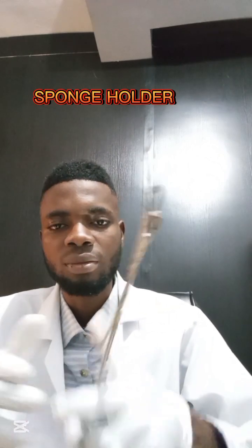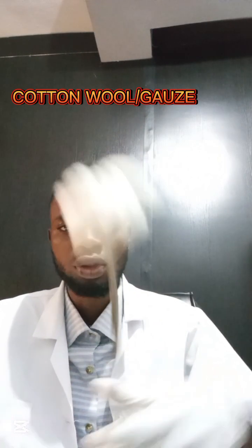Now another instrument we'll be looking at is the sponge holder. This is the sponge holder. Then we also have other instruments like cotton wool and the gauze. They are used for cleaning. So you use the sponge holder to hold the cotton wool, then you clean the lady up.